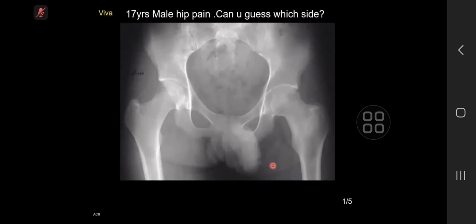So it's asymmetrical in that there's thickening or expansion of the femoral neck. Okay, I'll show you close up. Good, well done. Please continue. So within that, there's a lucent lesion at the inferior aspect with some. You're talking about this aspect? Yes. Okay, look somewhere here, please.